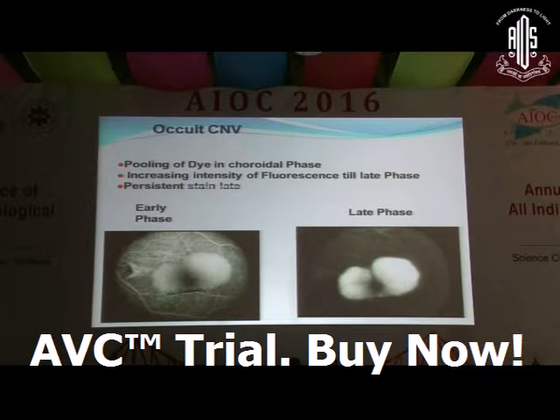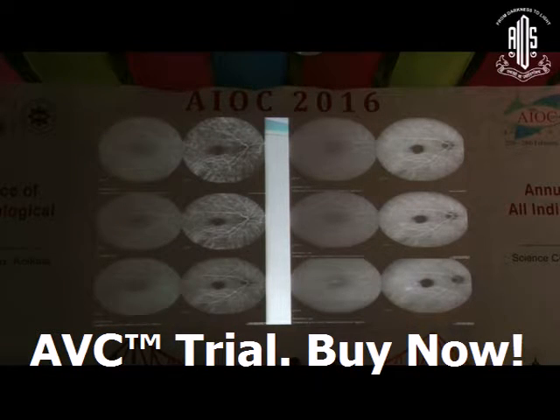The diagnosis is best made on OCT, or you might have to do an ICG angiography to diagnose these cases. Like in this case, you can see on the right you have a fluorescein angiography picture, on the left you have an ICG picture. On fluorescein angiography, you can see in late phase there is a mild leakage. You don't get much information on fluorescein angiography, but the moment you do an ICG angiography, you can see a block fluorescence here and there is a hot spot here.